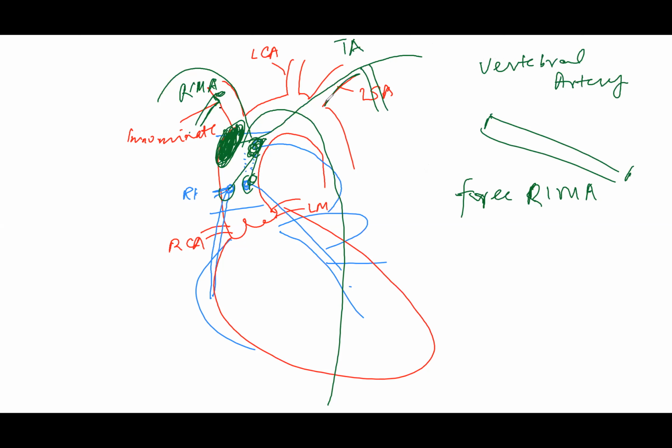But it's usually in this segment, somewhere in the top 1/3 of the subclavian artery, where it's giving the vertebral artery just close to that. And it's coming off the anterior wall. So you have to get the anterior wall. So the best way to get it is LAO 30 to 40 degrees for the lima and look at it. Because what happens in 30 to 40?